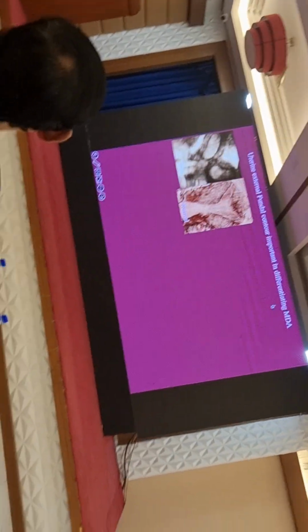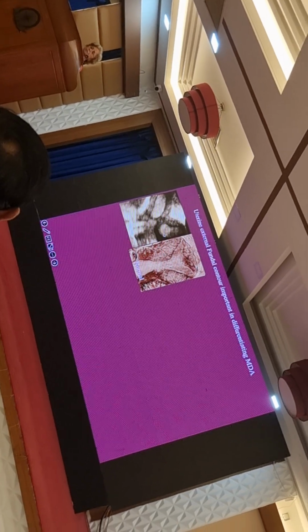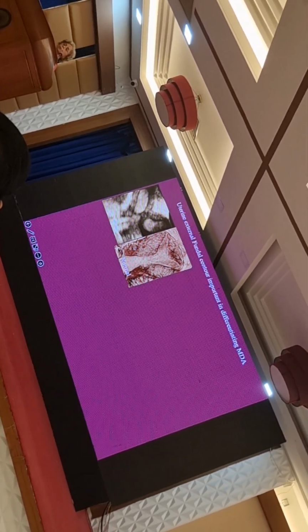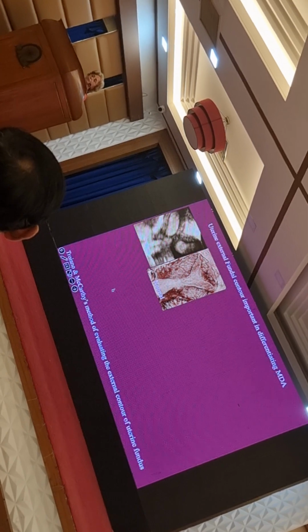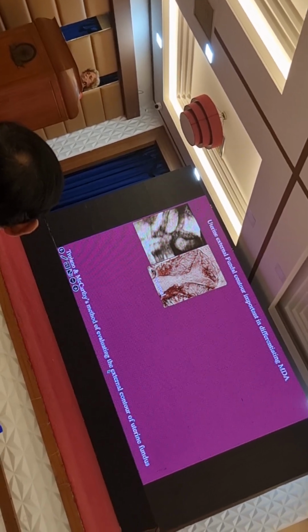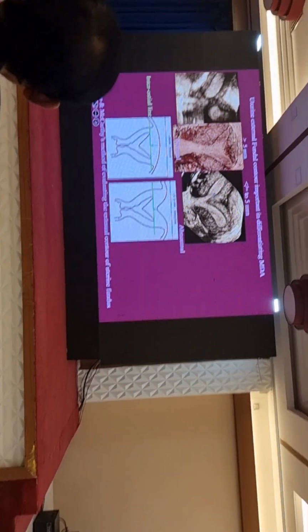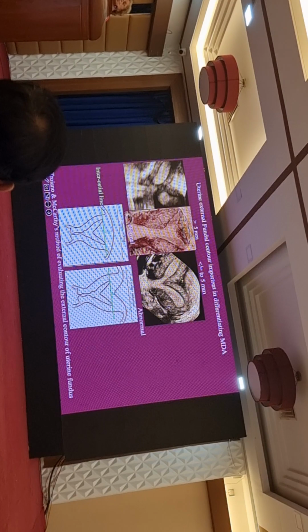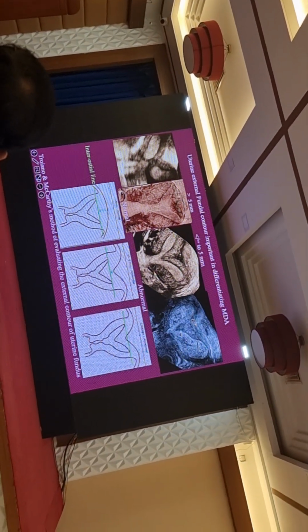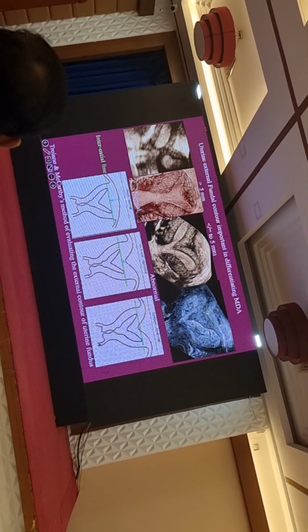External fundal contour is very important when we are trying to differentiate MDAs. Now, if we have two images like this, here we can see that the fundal contour is dipping below the endometrial cavity, and here it's nice and convex. So we cannot go wrong by saying this is normal fundal contour and this is abnormal fundal contour. There is this particular group who came up with this method to evaluate external contour in difficult patients. Now, this is one patient where we draw the interostial line and the fundal contour is still not dipping below the endometrial cavity. When we measure the wall thickness, it's less than 5 millimeters, so it's abnormal. And in this one, it is dipping below the endometrial cavity, so this is abnormal, and this was a good way of evaluating these.